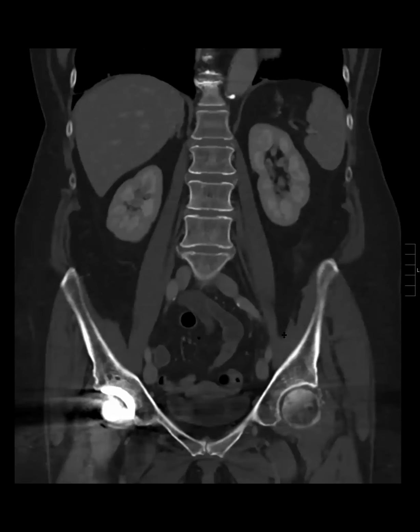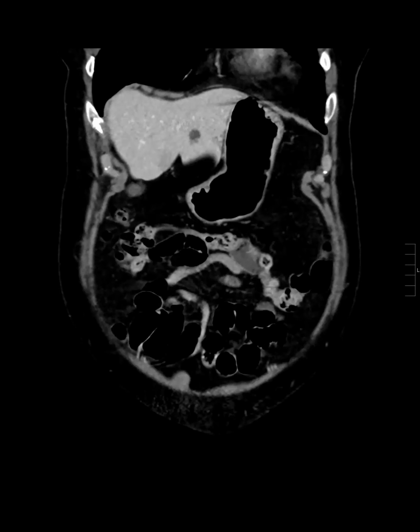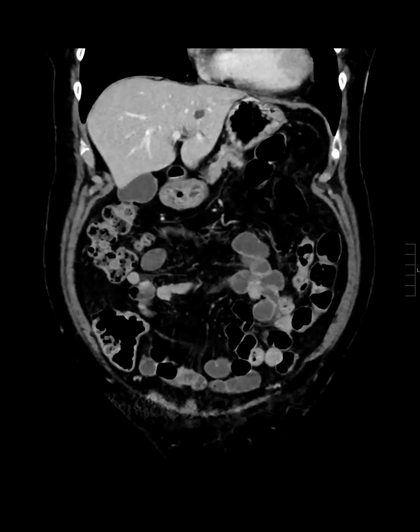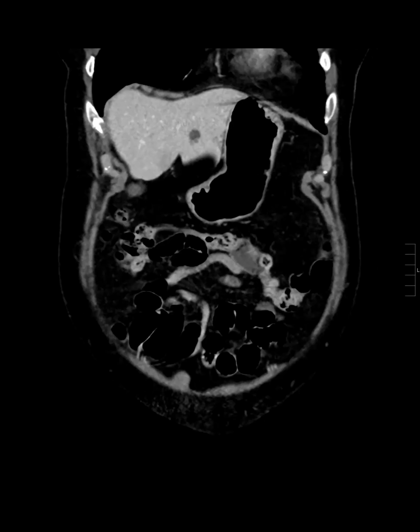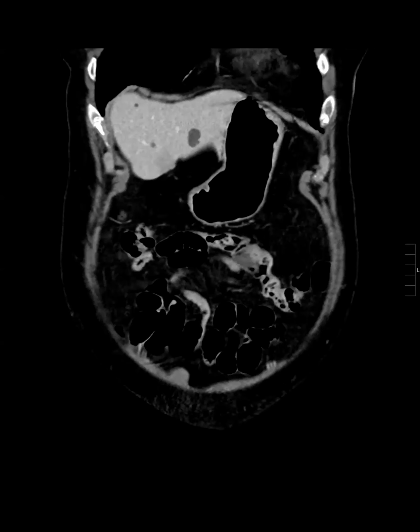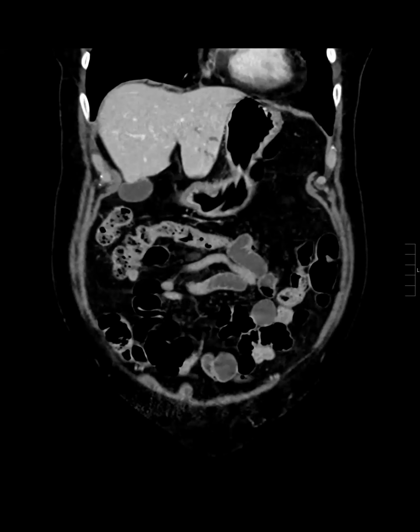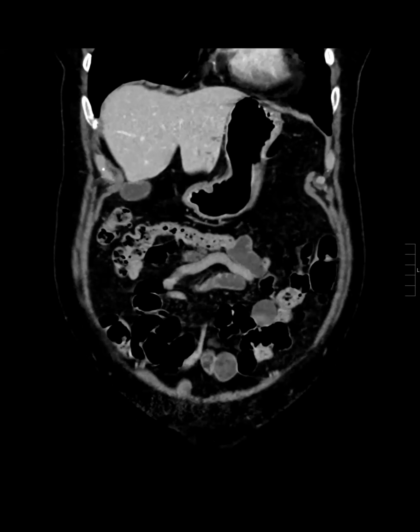Does this help? A vascular problem could have knocked off the blood supply to the left lobe and caused atrophy, but I don't see a vascular lesion or vascular shunting or anything. The patient's otherwise pretty healthy, with no history of liver disease. So we went ahead and got an MR with MRCP.